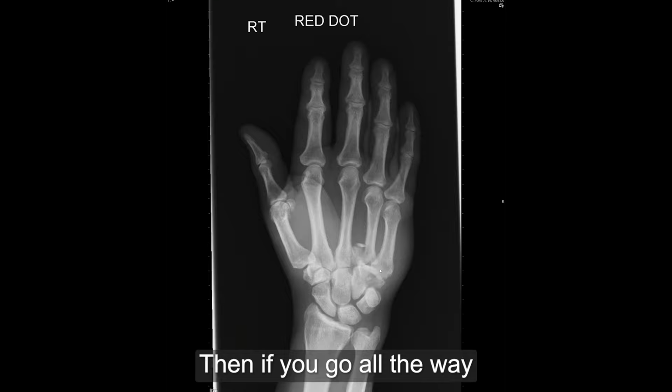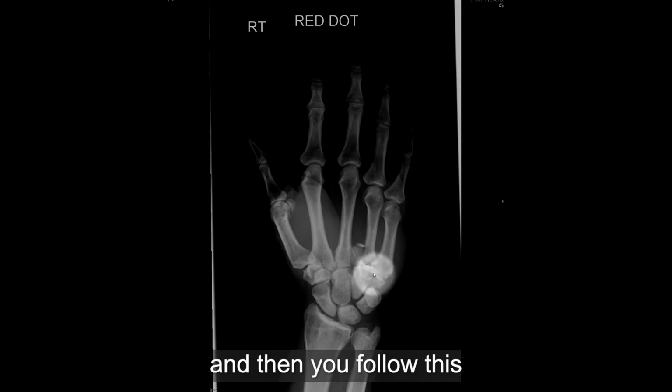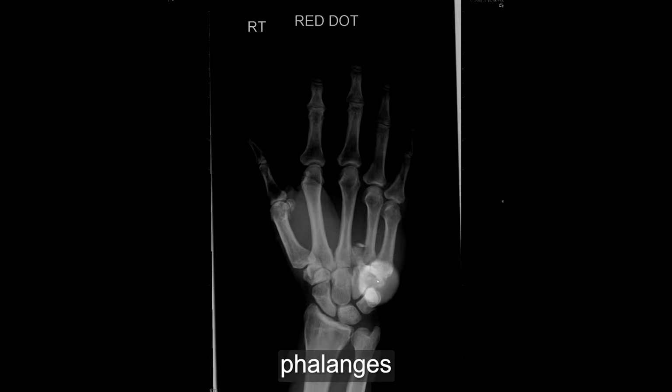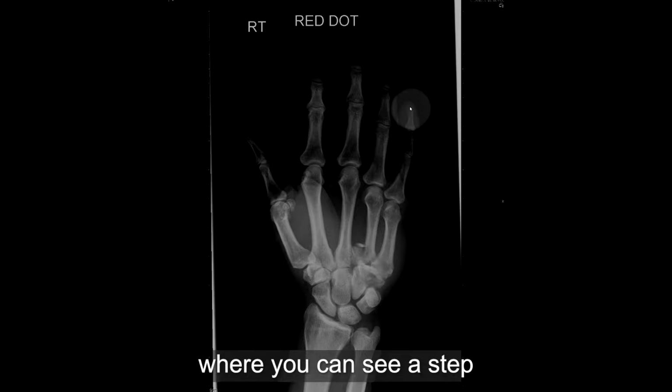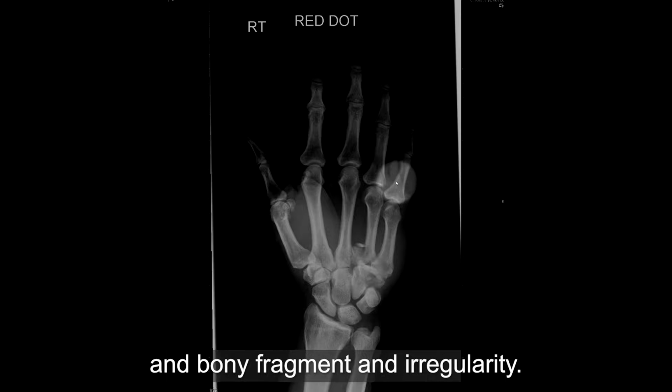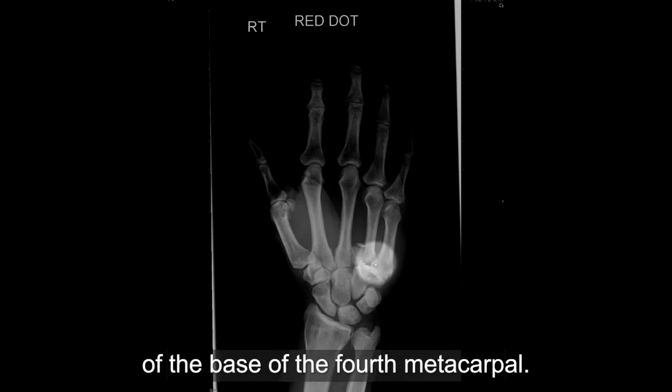Then you go all the way to check for other fractures, because we shouldn't fall into the trap of satisfaction of search. When we find something major, we stop. You have to keep continuing. And then you follow this line all the way to the phalanges and coming all the way back to the fourth metacarpal, where you can see a step, bony fragment and irregularity. So there's actually a fracture of the base of the fourth metacarpal.